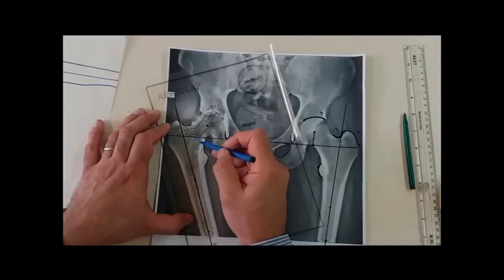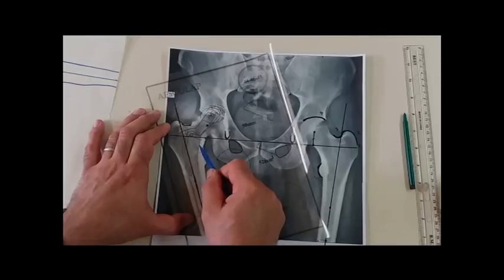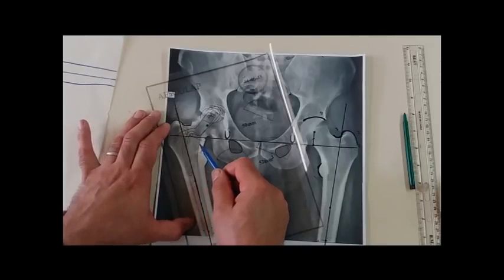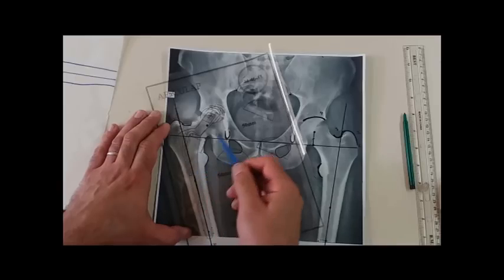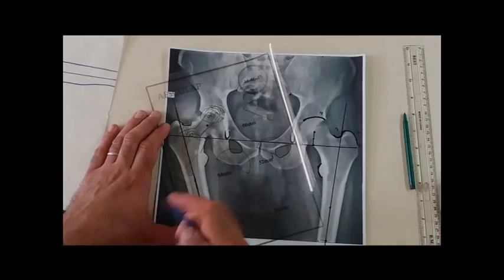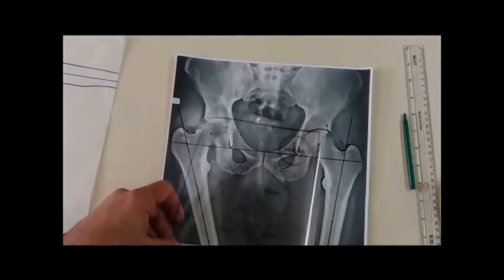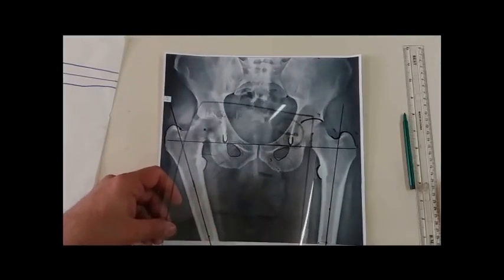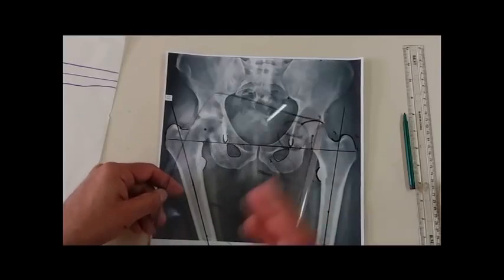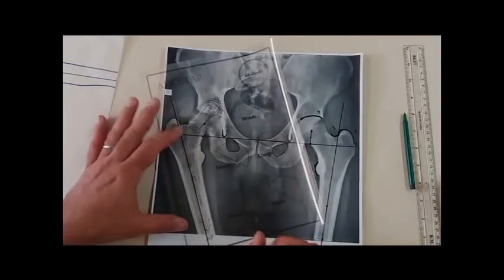The second one is that this curve on curve, this calcar, this is the curve of the stem. It should fit curve on curve, so that during reaming I will not face the problem of broaching the calcar. By doing this, I am satisfied that this stem is optimal. If not, I can choose another template with another size. For example, this is size 12. I have from this manufacturer from size 15 or even more. So I start downsizing the stem or upsizing accordingly.